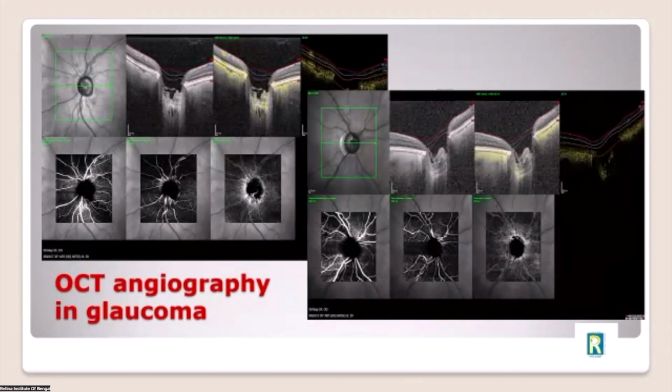And another interesting thing is that when in the early stages there is a doubt that it may not be glaucoma, then we have OCT angiography on top of everything. This OCT angiography is done around the optic nerve head. It shows the defect. Can you see this dark area? In glaucoma, this peripapillary vessel defect appears here. So OCT angiography in Spectralis also highlights that yes, there is a defect.